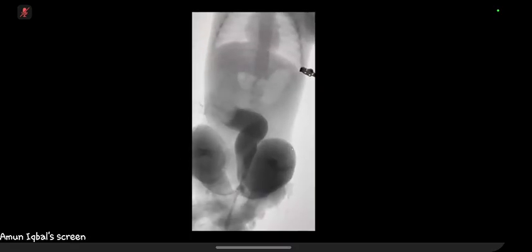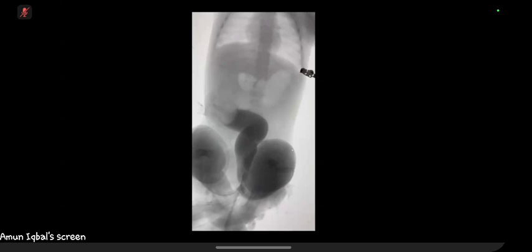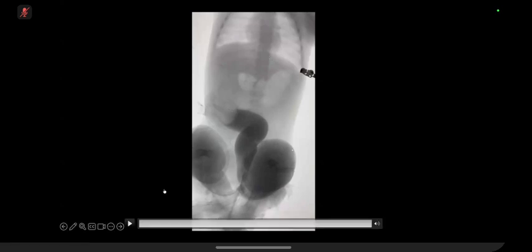In this fluoroscopic image, also there is progression of the barium level in the sigmoid colon. However, there is no complete resolution of the intussusception. And in this third clip provided to me, I can clearly visualize the meniscus sign. However, the intussusception has not yet relieved. I am not able to visualize any extra-bowel spill of the barium, suggesting there is no rupture.